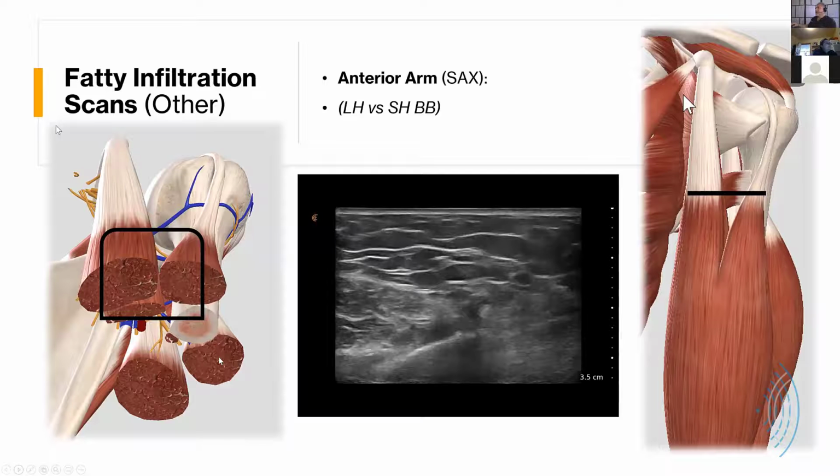Let's see if I can go on to this last one. Like I told you to begin with, the scapula itself is what we focused on today in most of our primary imaging scans for your review. I have several examples of how this exact same theory of identifying fatty infiltration in contractile tissue continues to be of value to us. This is another example in the arm.